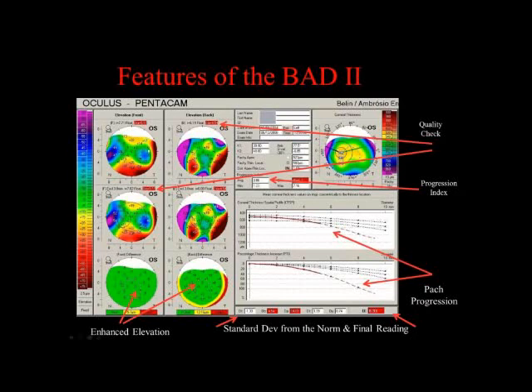So, confusing but very informative slide. This represents the anterior elevation on the standard reference surface. This represents the enhanced reference surface. Again, you'll see this represents the exclusion zone. That dot represents the pupil. And you'll notice this other circle seems a lot smaller than I showed you before. It's not at 8 millimeters, because you don't have adequate coverage. And that's why you have this big red box here showing you a number that's 5.17.